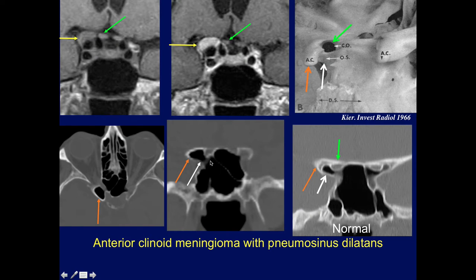And here, there's pneumatization of the clinoid and also the optic strut, which is the bony bridge connecting the clinoid to the body of the sphenoid, more pneumatized than the opposite side, although normally it can be pneumatized, as you can see here, again, a clinoid and a pneumatized optic strut. Again, on this anatomic specimen looking from behind, again, the clinoid laterally, optic canal. This is the bony strut, like a bridge between the anterior clinoid and the body of the sphenoid.